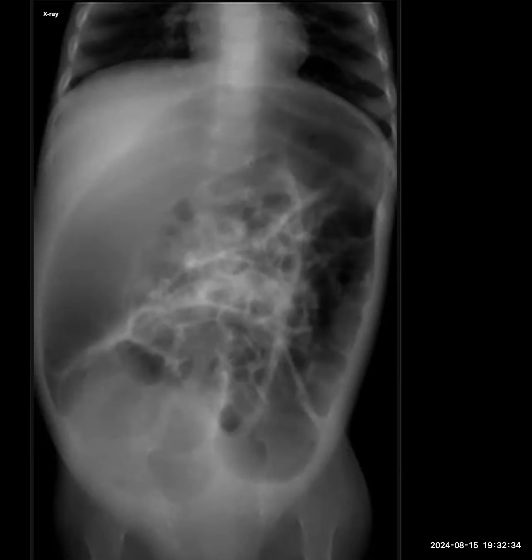Before you do that, what if I tell you that this is a neonate? Will that change anything for you? Okay, this is a neonate. I do not see the rectal gas shadow, and I see there is a large distended bowel loop. So I think this could be a low intestinal obstruction, and I think Hirschsprung's disease is one of the differentials.